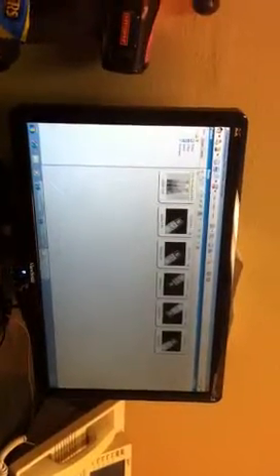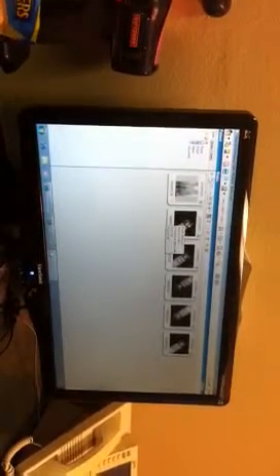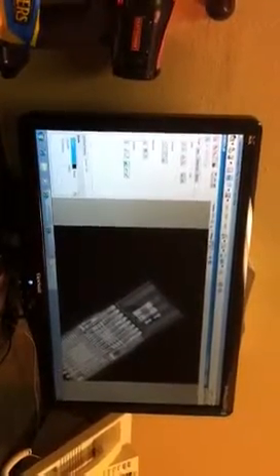The first button here, let's say you wanted to compare a couple of images, or open several images in sequence, rather than opening one like this and then viewing it and potentially doing something to it, like putting an annotation on it, drawing an arrow, or adding some text.